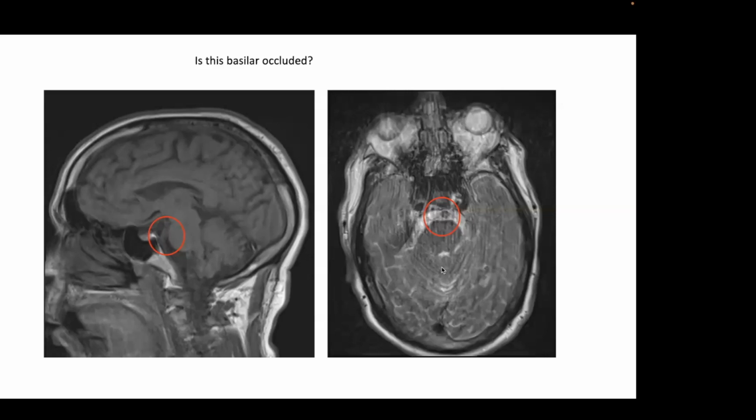Hello, Dr. Mamourian. To be honest, I don't think this is fully occluded. Okay, so I think that is a reasonable statement.